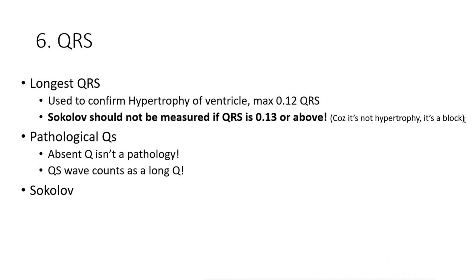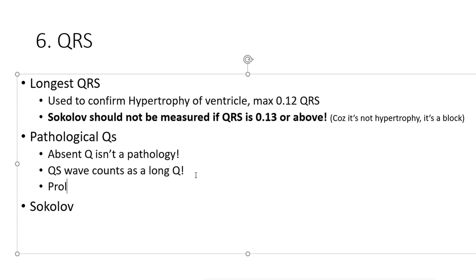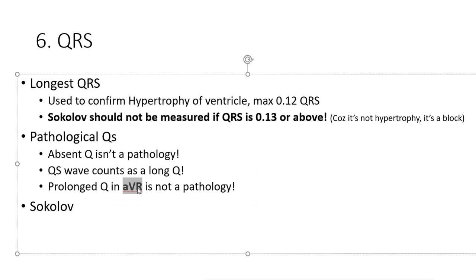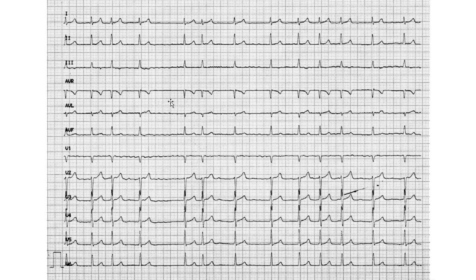Excuse me for adding on the QS. A prolonged Q in AVR is not a pathology. In AVR it is not a pathology. So back there, AVR, we skip AVR.